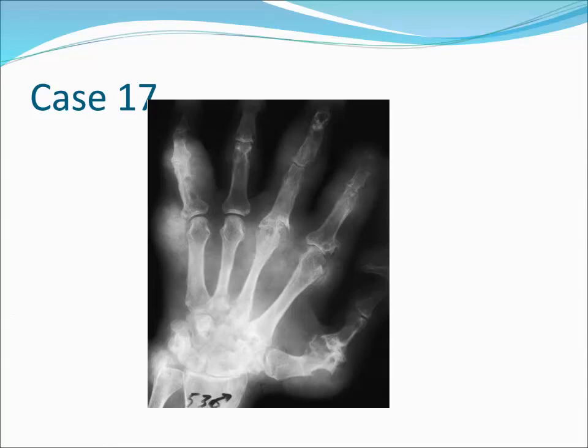The arthropathy caused by gout is very characteristic radiographically, yet it is not commonly seen. Why is that? Because it takes 4 to 6 years for gout to cause radiographically evident disease, and most patients are successfully treated long before the destructive arthropathy occurs.